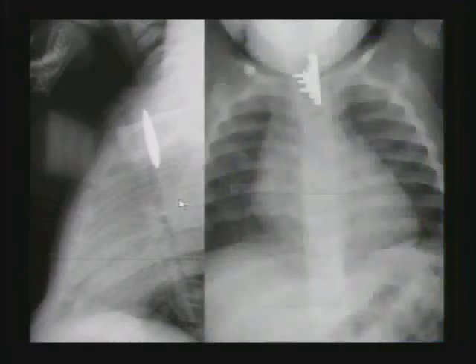I think it's a quarter or nickel, dime. It's actually the ship from Monopoly. It shows the importance of two views in radiography. It's a different case. We used to put Foley balloons and blow up the balloon and pull the coins out, but it was relatively contraindicated in the children who had a thick space between the trachea and the esophagus. We don't do this anymore, maybe for medical legal reasons or the surgeons want the business, but it was a brutal procedure. We did it a lot, and so I'm glad we're not doing it anymore.